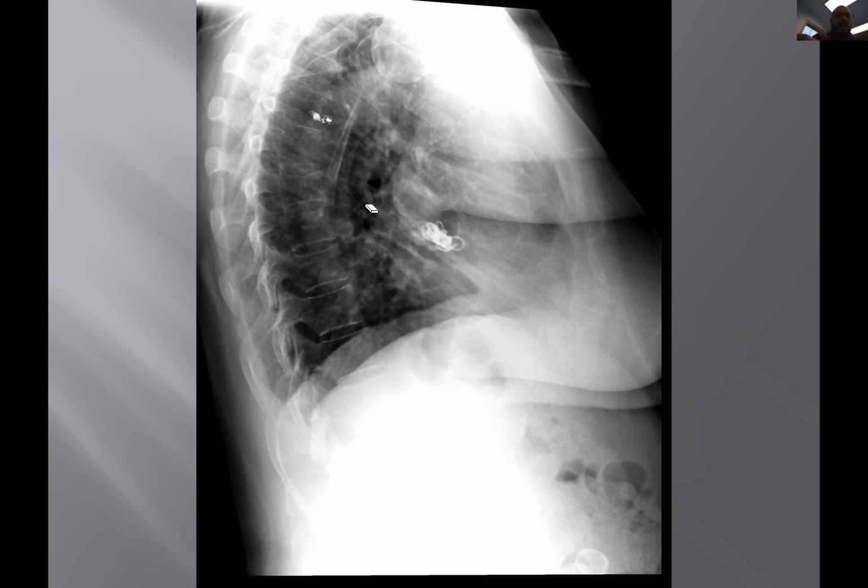You don't want to say, hey, I earned my paycheck. I found the compression fracture. I've done my job. No, that's bone. Go to cartilage and soft tissues. Don't get search satisfaction. Look at all 4 corners of the film under detection. And when you do that, can anybody see another finding that you identified that I think is kind of important?